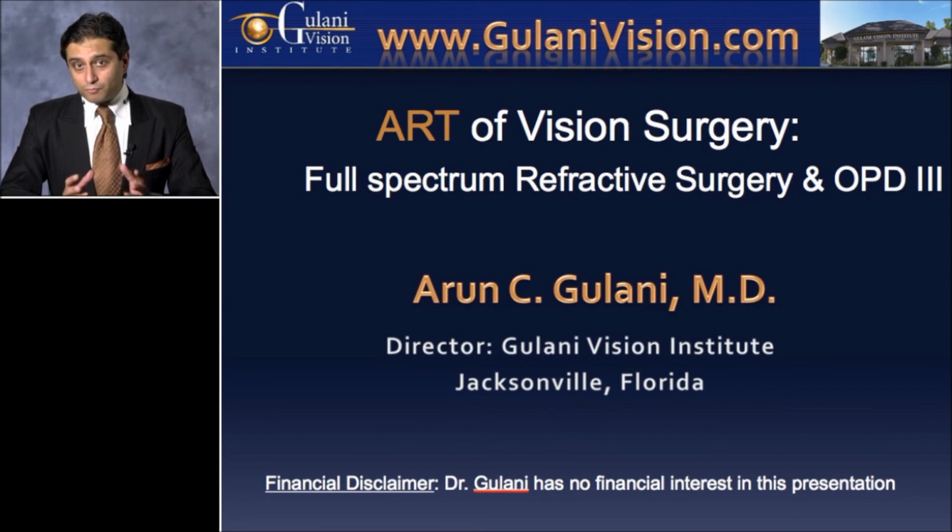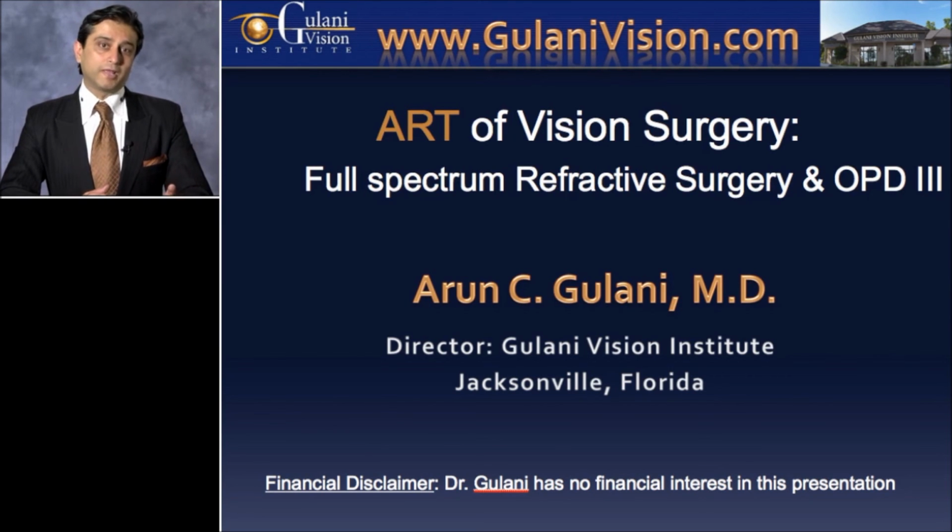The plan actually unfolds after the investigation is done, which is, let's say in this case, a patient comes in with any case scenario. When you do the OPD-3 testing, the efficiency of the technology allows me to get the refractive error, keratometry, spherical aberration, pupil size, angle kappa. All of these data then allow me to decide what in fact is causing the vision complaint that the patient has. Which element of our optical system is causing that complaint, so I need to direct my attention to it. And how many elements do I need to correct?